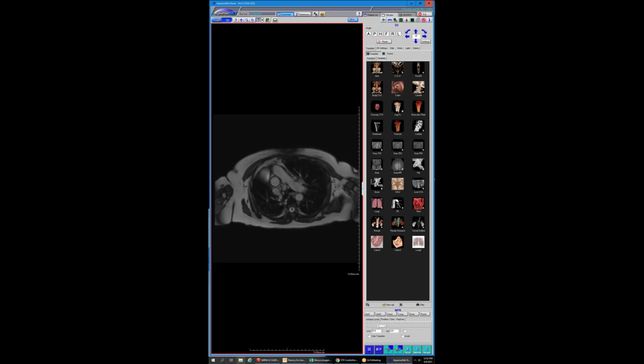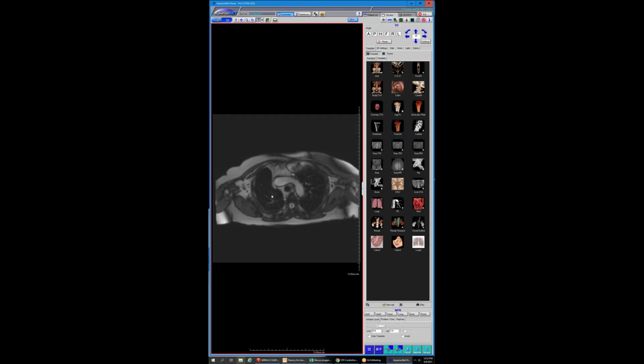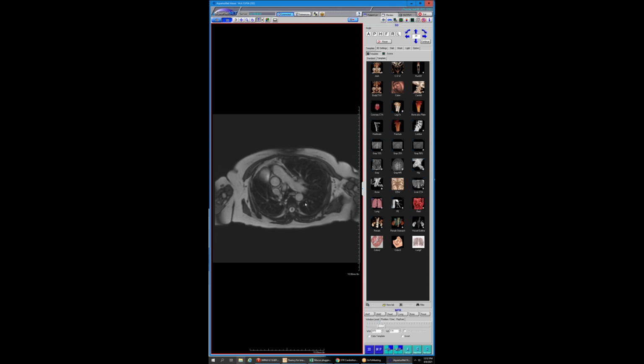So by the heart twisting way over to the right like that, the left lung is doing the work of the left and most of the right lung too. If you look at the vascularity on the right, it's definitely not as pronounced as on the left. Right. But we do see kids that come in with this.